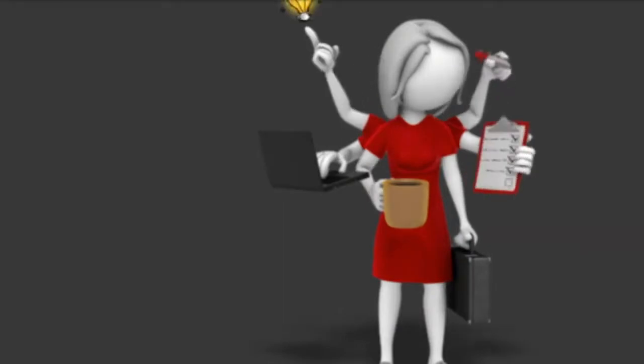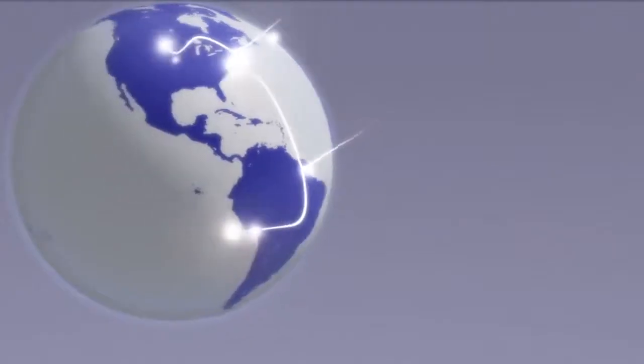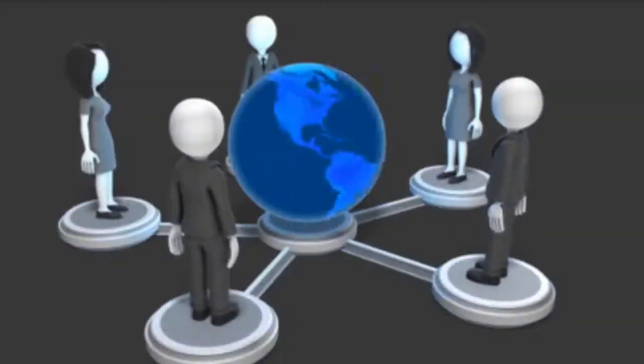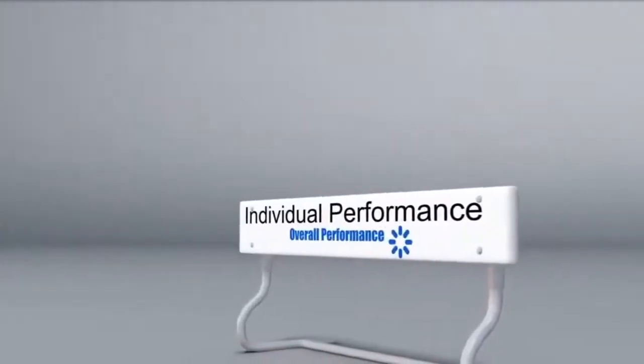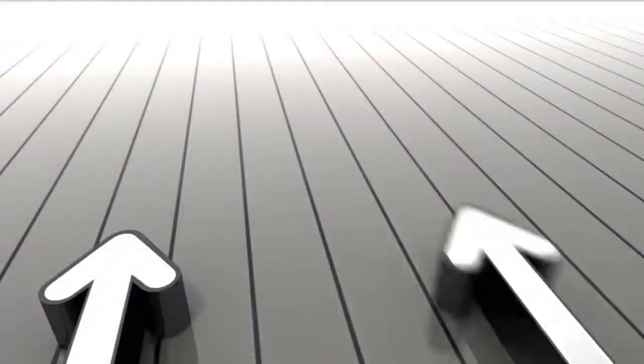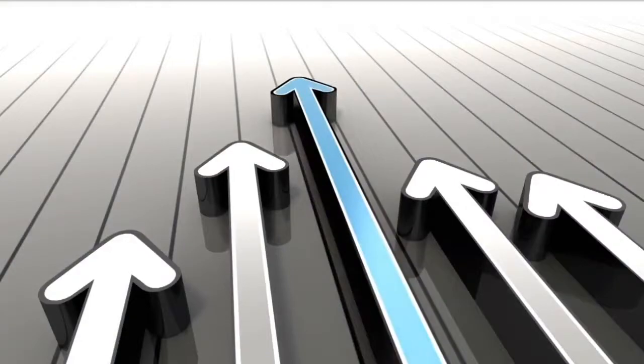As an administrator, you may manage multiple offices or different practices and run population reports from each one of them or all of them globally. For example, an ACO, managed care, or third-party administrator could track each practice's overall performance and compare their individual performance, or their overall performance by any criteria that is needed within your organization to track.